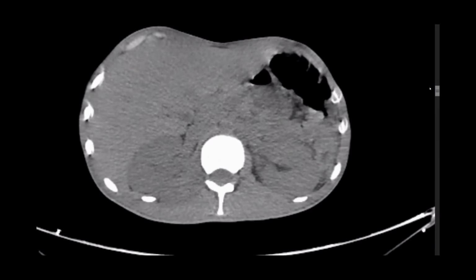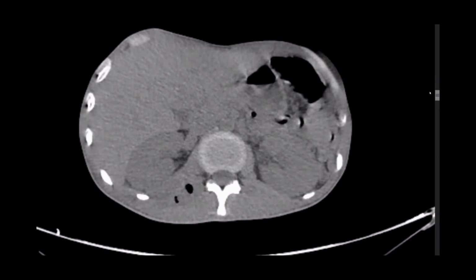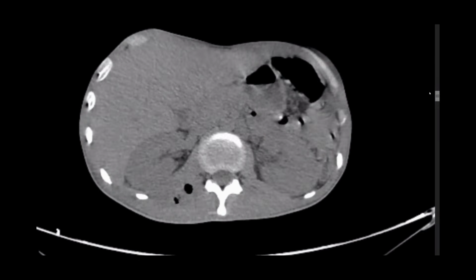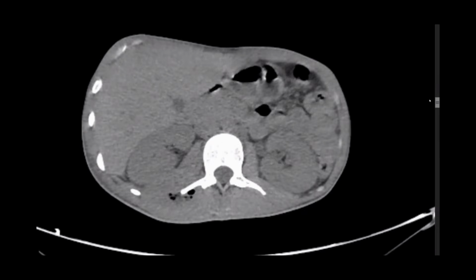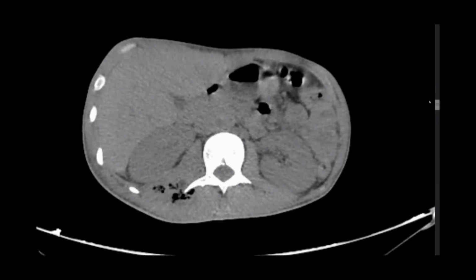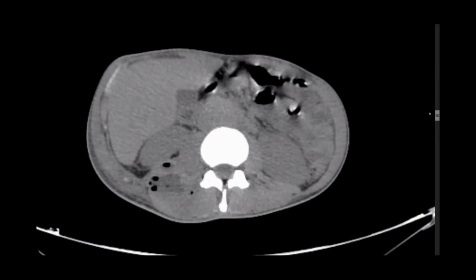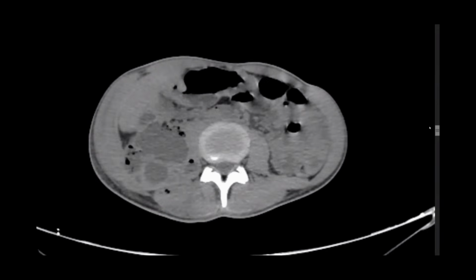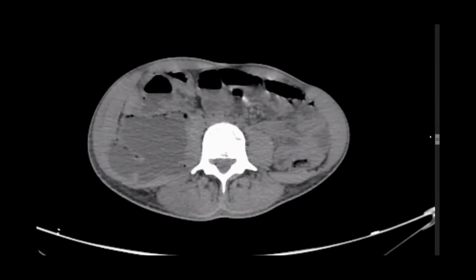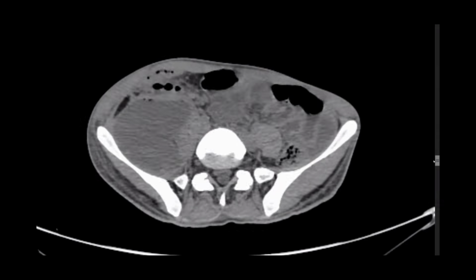There is an obliteration of the retroperitoneal fat on the right side with a low attenuation collection noted, inseparable from the posterior renal cortex and extending into the adjacent posterior paraspinal musculature. It has low attenuation foci within it, which is likely in keeping with air, as the fat attenuation is different at this level. It is extending lower down into the psoas muscles, with a multiloculated, multiseptated appearance extending partly into the retroperitoneum as well, having a thick multilobulated appearance, and is continuing.